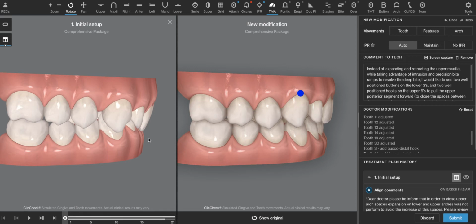anterior guidance. Right now she has a very deep anterior guidance, also known as being trapped. But by doing that, what we are looking to see is, will the mandible relax down and forward, or relax forward, so that the molars are in a better relationship?